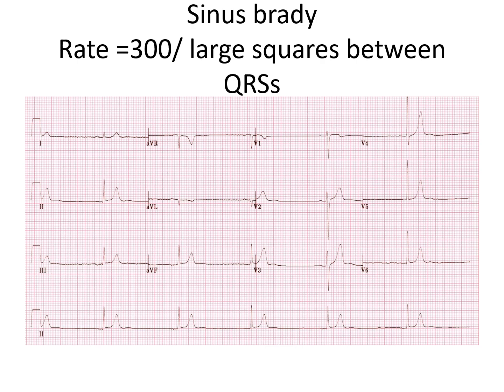We can look at the intervals and see the P's, which in this particular case are best visible in lead 3, lead V3 as well. The PR interval is quite normal and the QT interval is quite normal. And we do have a P present before every QRS and QRS after every P. So it is sinus.